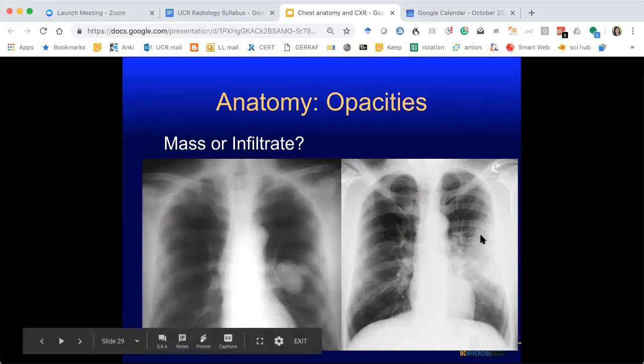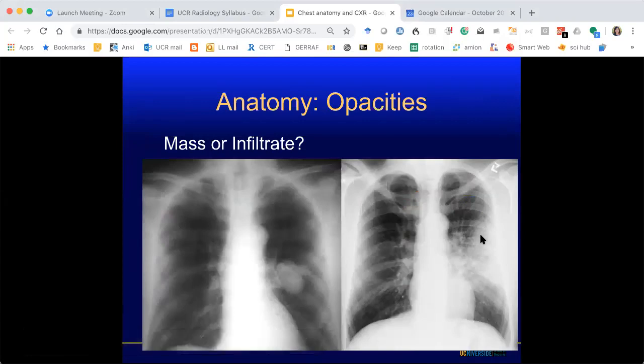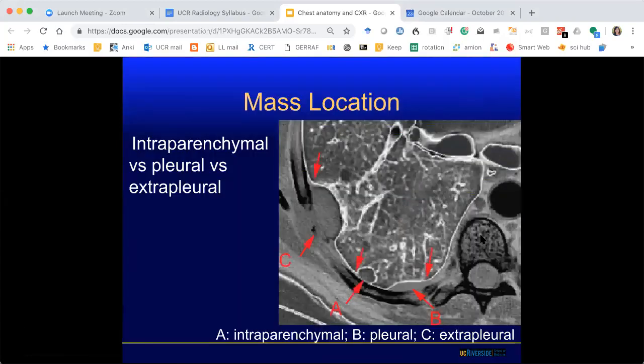So it's an infiltrate following the bronchial branch anatomy. Yes. So looking at the morphology helps you identify which space they're in, because what you think it is, the differential diagnosis, will depend on where it is, the spatial relationship.